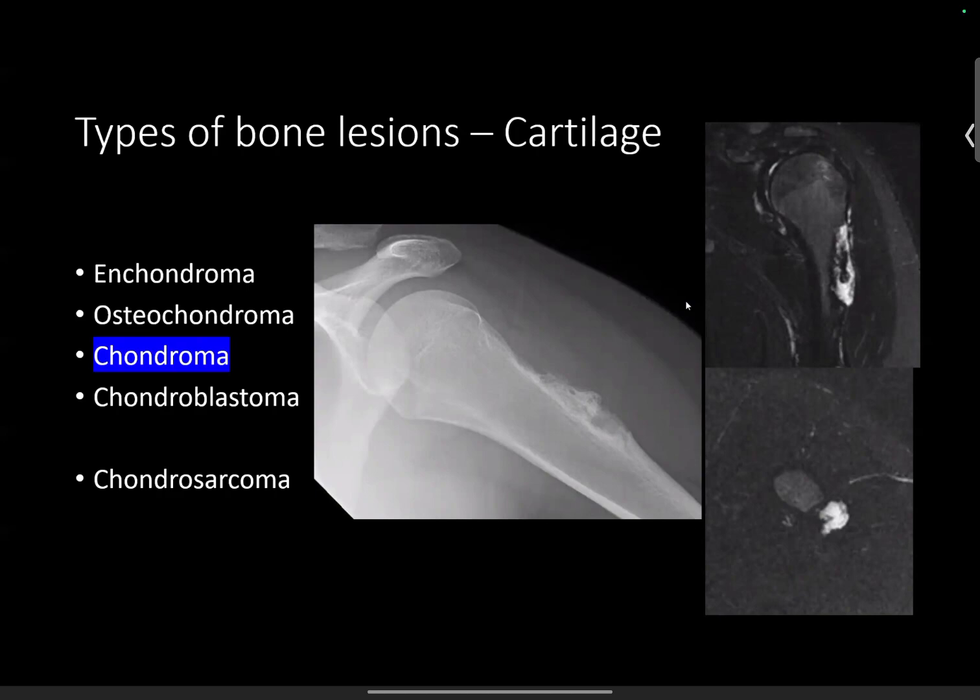Awesome. Good. So the next question is, septae enhance in which lesions? Right. So anything cystic is going to have a wall and might have septation. So for all cystic lesions, you're going to have rim enhancement and septal enhancement. So that's just okay to expect that, and that doesn't mean that it's malignant.